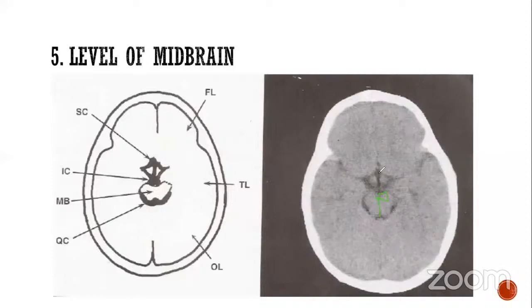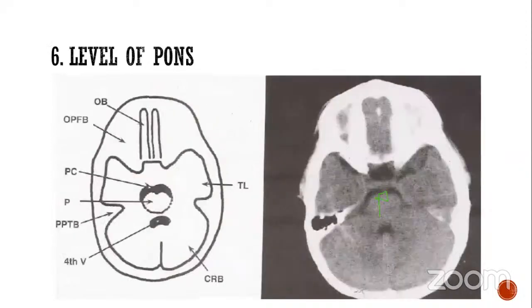And that is the circle of Willis also. The circle of Willis surrounds the interpeduncular and suprasellar cisterns. The anterior, middle, and posterior cerebral arteries are visualized in this film by contrast media. Next one is at the level of the pons.